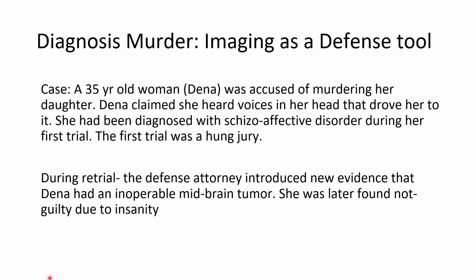But I wanted to demonstrate to you that this is something that's actually happening a lot more these days, that people are using PET scans and even sometimes SPECT studies to look at psychological or mental health disorders that may have been the cause of abnormal behavior that led to them committing a crime.